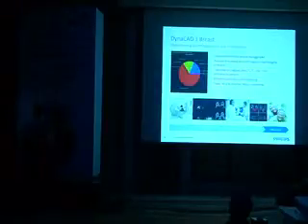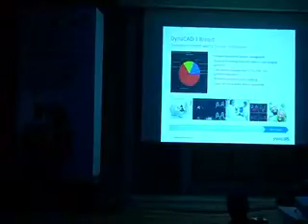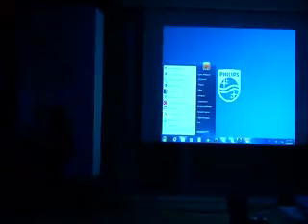So this tool helps to get enhancement in breast disease management and reduce processing time, and of course very nice color overlays in short and in one click. I would like to show you a very fast demo on a case, how we can do it on this tool.